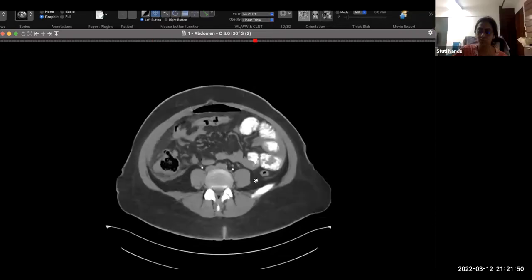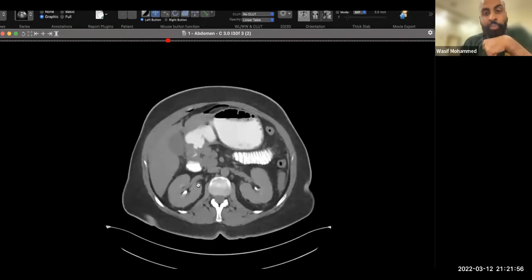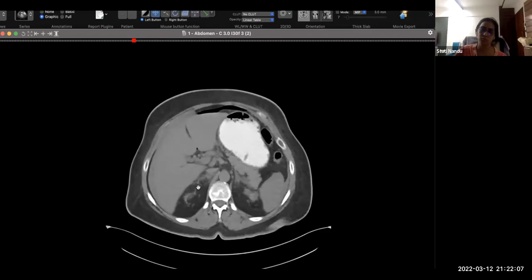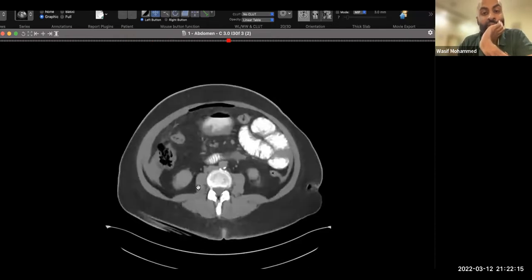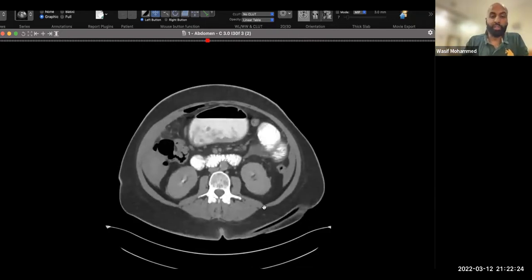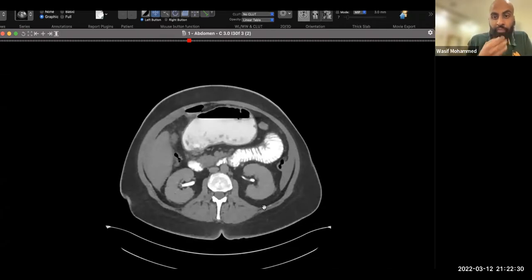This is a young patient, unlikely to be a perforated large bowel mass. So I'm looking at the proximal or upper GI, and I can see that there's thickening of the duodenum, there's fat stranding, and there's also air tracking very closely to these abnormal appearing duodenal areas. So I'm highly suspicious of a perforated duodenal ulcer in this case. Just looking at the rest of the scan, there's no evidence of diverticulosis or diverticulitis. The large bowel appears fine. I would urgently inform these findings to the referring physician or the surgeon, and this patient would probably need operative management.